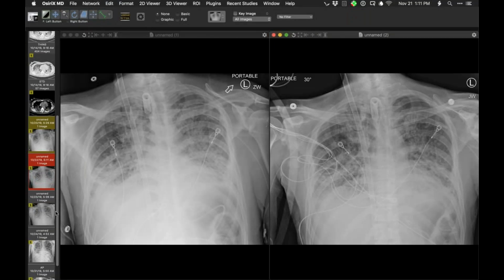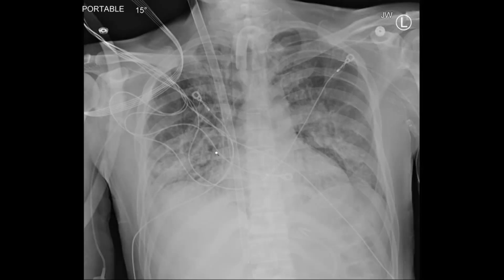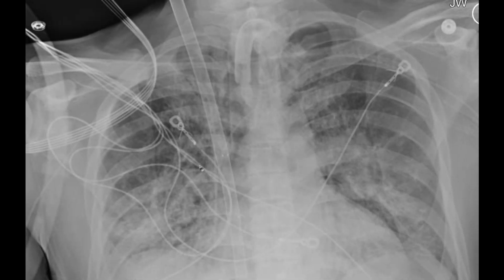So let me bring in another exam to show you that as well. Now here, and this is to show some signs of pneumomediastinum, is a really nice example of the double wall sign in relation to the right tracheal wall. But this time we actually have the equivalent of the ring around the artery sign, except that the air is about this portion of azygous vein. So it's a partial air about azygous vein sign.